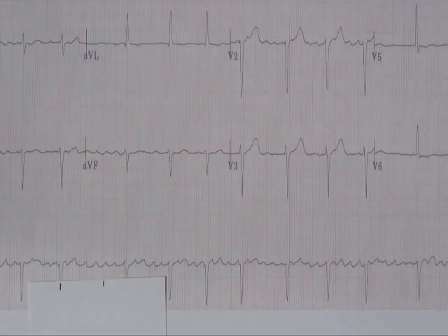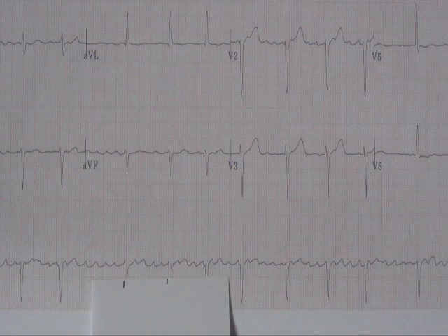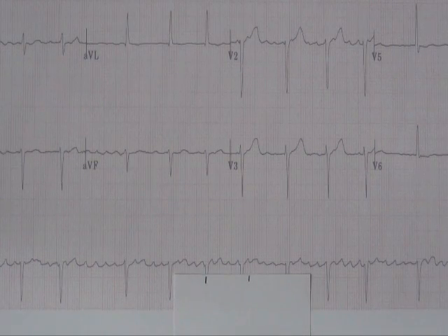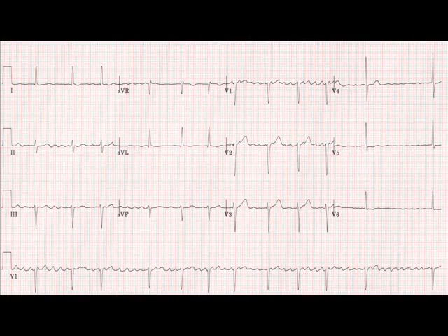If it doesn't, it's irregular, and it doesn't here. It's an irregular rhythm. Therefore, alarm bells are ringing that this is highly likely to be atrial fibrillation. It may not be, but it's highly likely because the most common cause of an irregular heartbeat, and you could take the patient's pulse as well and feel that irregularity, is atrial fibrillation or AF.